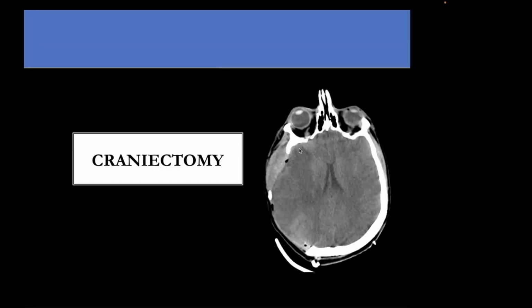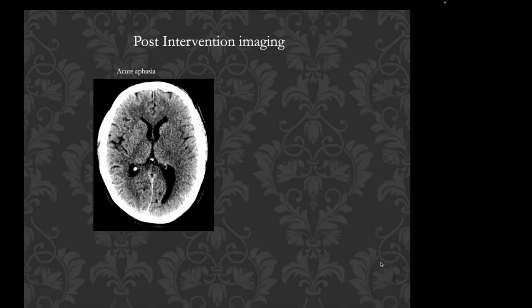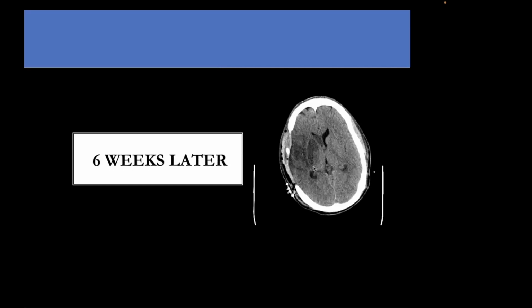But craniectomy is often used in patients with these large territory infarcts to prevent fatal herniation from the uncontrollable swelling of the infarct. And then later we see the encephalomalacic changes. This was an ICA occlusion, again, caudate head, lentiform nucleus, MCA territory. There's some sparing of the MCA territory. This may have been an intervention in here. And now you see that there is this relaxed border of the brain as the swelling has gone down, and eventually the flap will be replaced here after the craniectomy at this point in time.